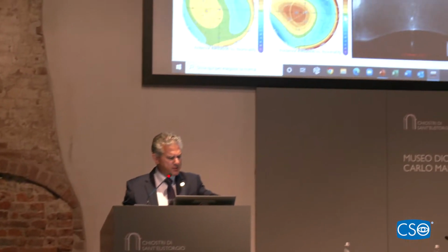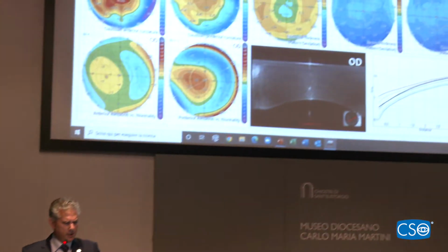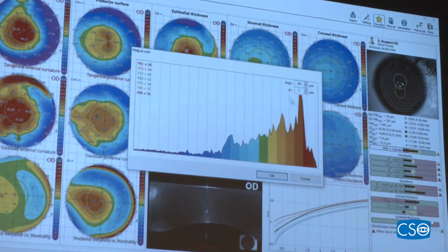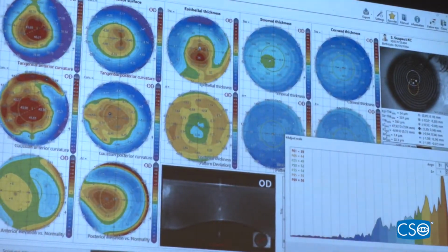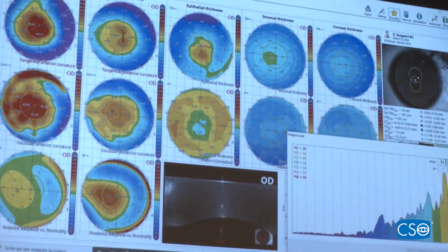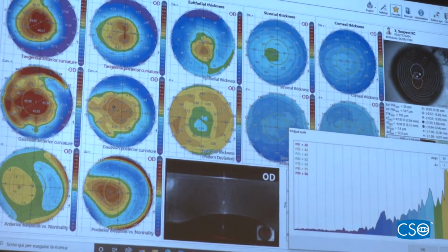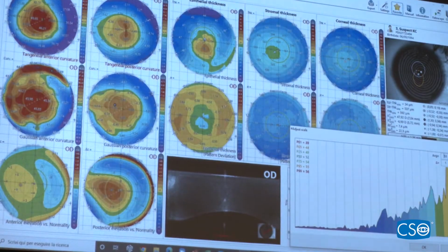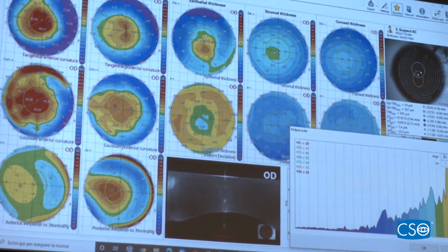Same thing again, back surface is very, very strange. But epithelial map, as you can see, no, there's no way. There is no donut of epithelium. There's no focal thinning with thickening around it, as we described it in our 2009 paper.